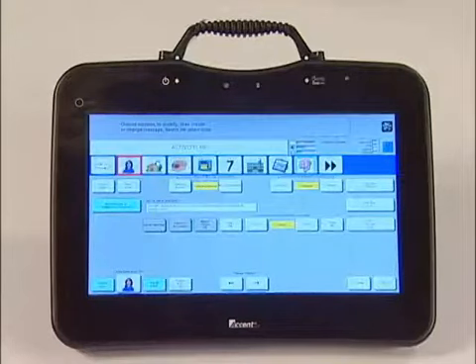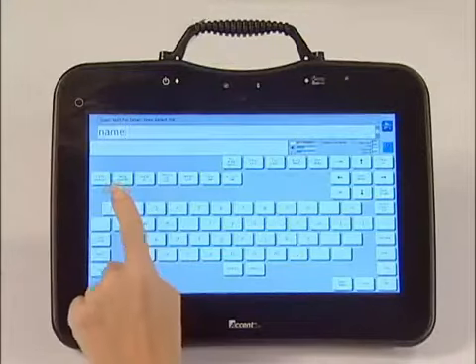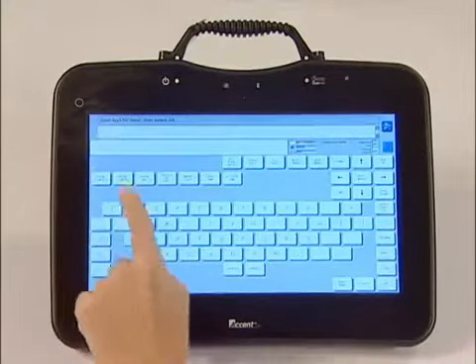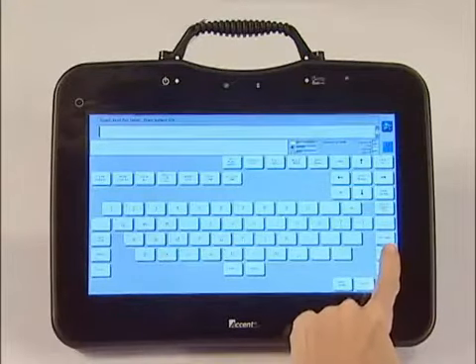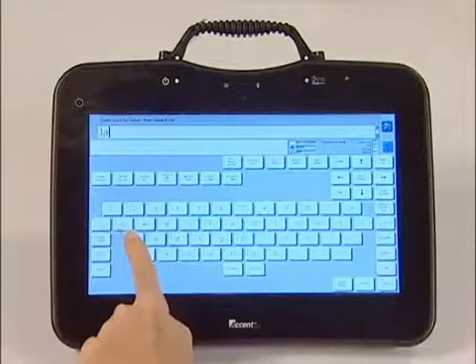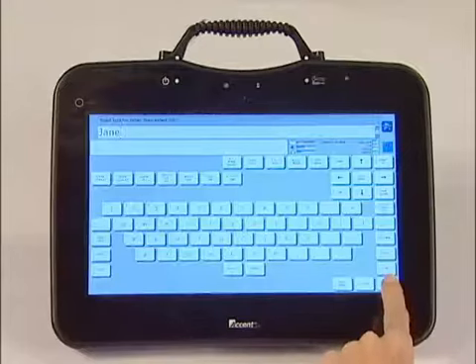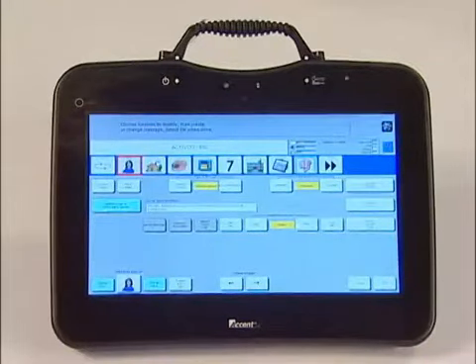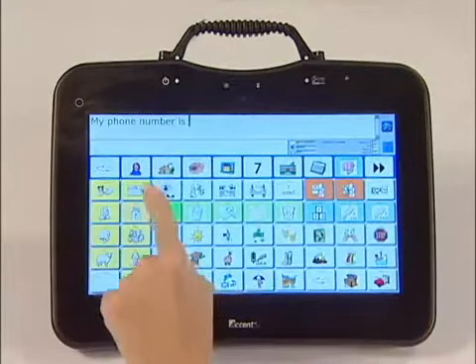Finally, change the label by touching Change Label. The label is the word that appears above the symbol on the key. First, clear the label by touching Clear Display in the top left-hand corner. Then type the person's name. Press OK. Your key is now programmed with a symbol, message, and label, so press OK one more time. Now you can play the message back.